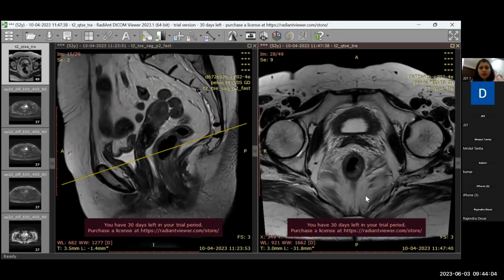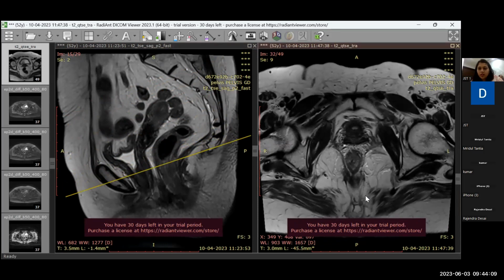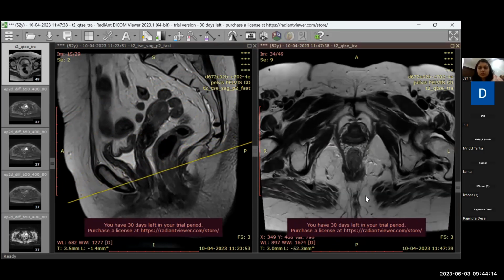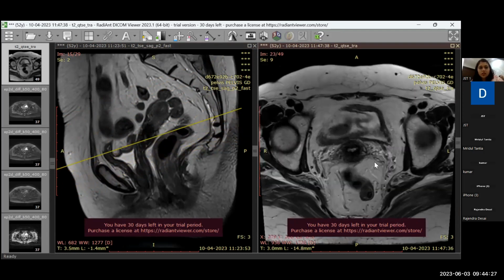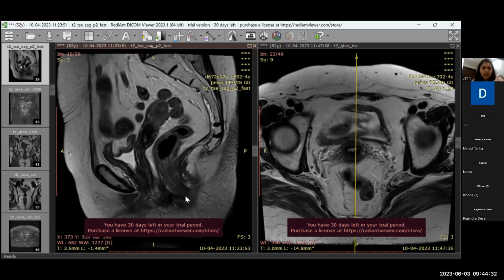So in this case I've got to mainly delineate the anatomy on just one sequence. As we can see, these are the oblique T2 axial images we have taken. The tumor actually is a very polypoidal tumor and sits here somewhere. We'll discuss about this later. Just to see the anatomy, we'll go from the anal verge to the sigmoid takeoff. So this is the anal verge, the lowermost limit, and then we have the sigmoid takeoff somewhere here, about S3 level anatomically.